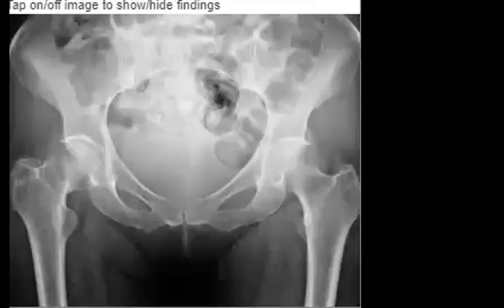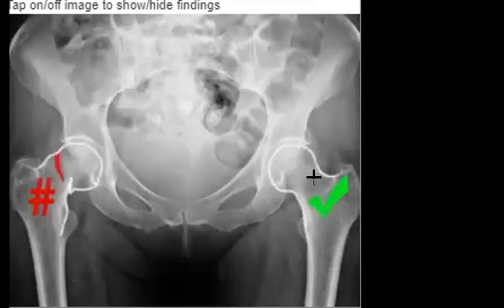And when you check here in the pelvis, you compare between both sides. Sometimes both sides are affected, but if you are lucky like here, with a fractured neck of femur, usually it comes unilateral. So you will find it in one side with the lucency interrupting. So the comparison sometimes is very useful for fractured neck of femur in this case.